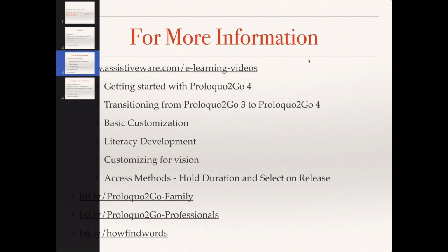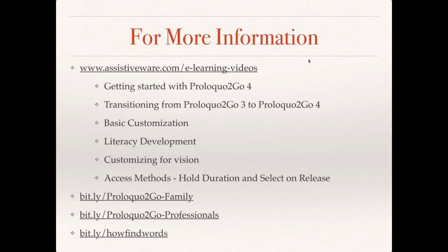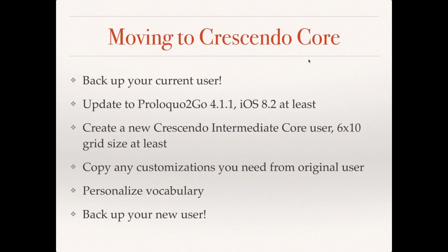On this e-learning videos page. And back up your user on a regular basis and get it off of your iPad in case someone, God forbid, deletes the app along with all the backups that are inside of it. It will save you a lot of grief in the long run. So then the next thing you do is make sure that you have updated Proloquo2Go. The currently released version is 4.2, but if you have 4.1.1 or later, you should be okay.